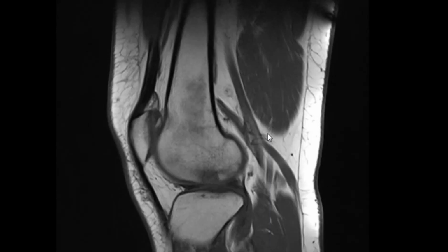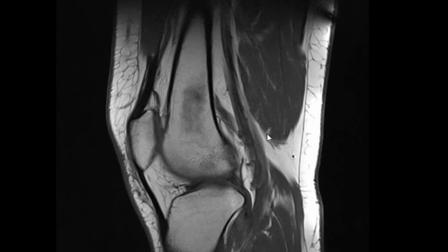So probably it's not as big as we used to see it, but still it is bone infarct, especially since we have not explained the pain. The medial meniscus is good, the lateral meniscus is good, the patella is good, the ACL is good, the PCL is good. We have no explanation for the pain, so this can be a very good explanation for the pain. Now, the patient has bilateral limping.